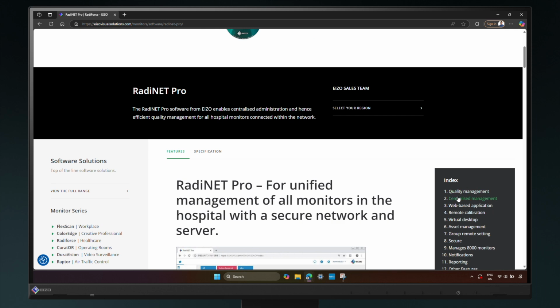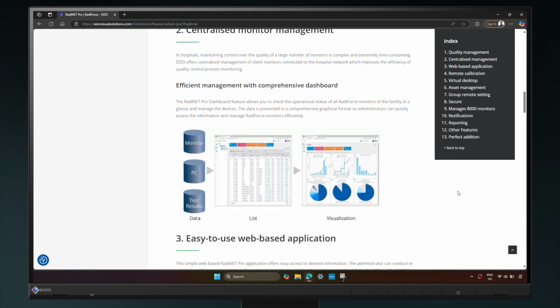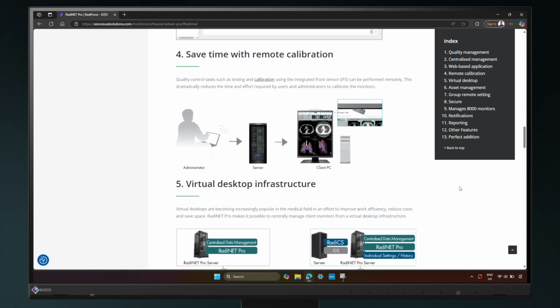It lets you reach in and extract the information that's being kept on those radiology workstations and aggregate them into reports by site, or by room, or even by specialty. Let me show you how it works and what it looks like.